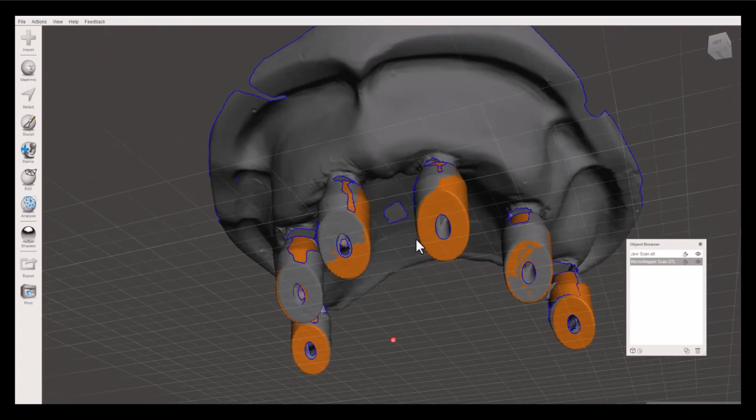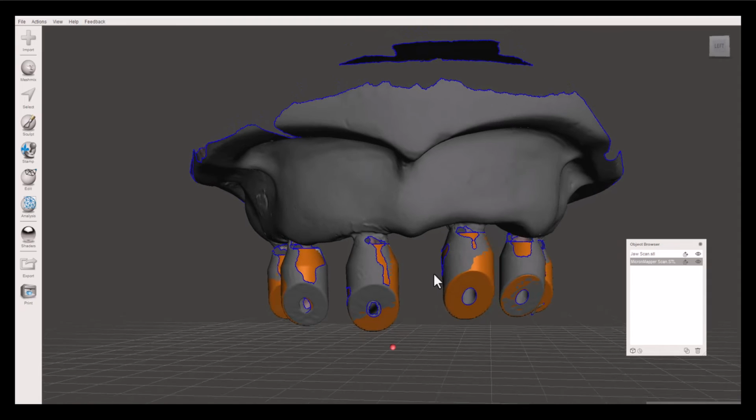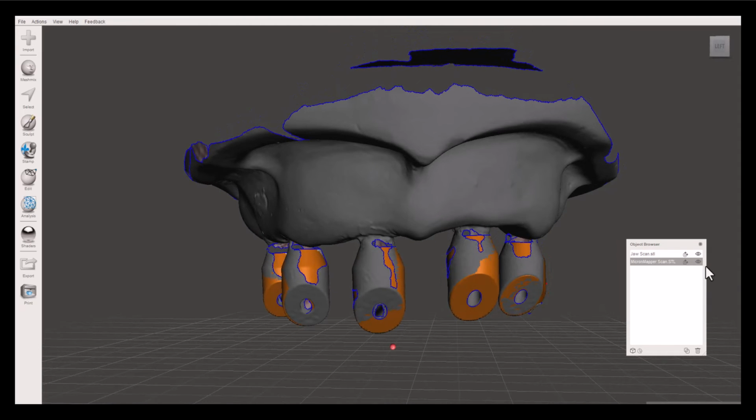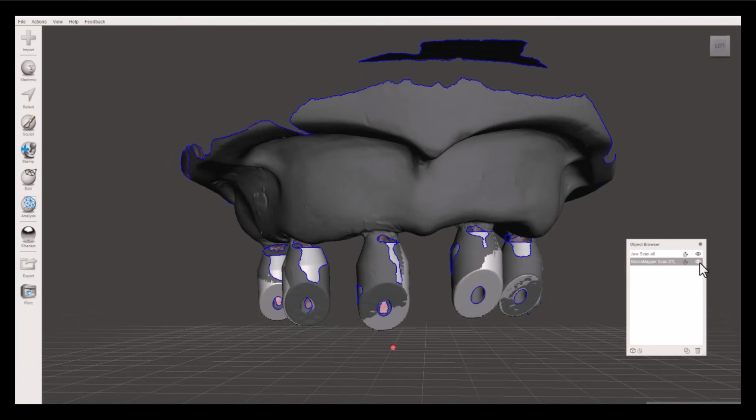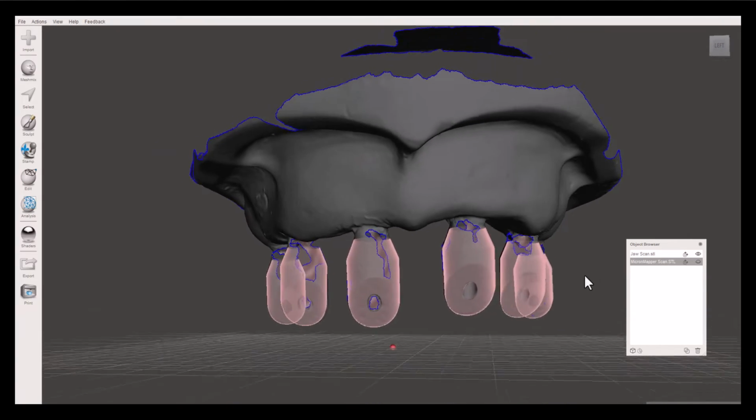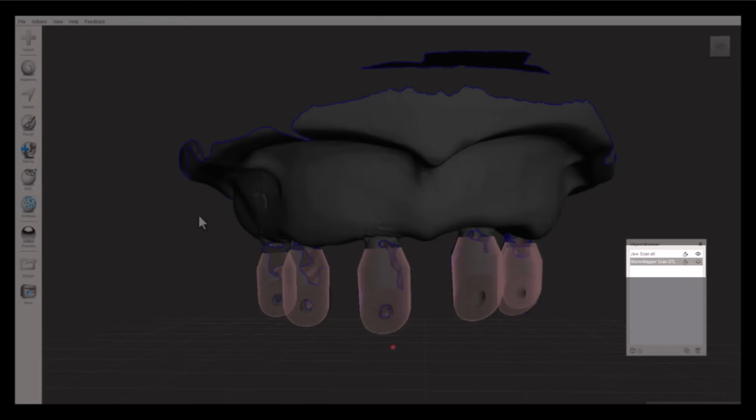There are now two meshes. One is an intraoral scan and another one is a photogrammetry scan. Overlapping intraoral scan needs to be removed. There are two ways to cut out the parts. In any case, you will need to hide photogrammetry scan by pressing on the eye icon.